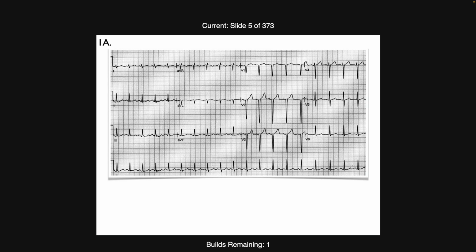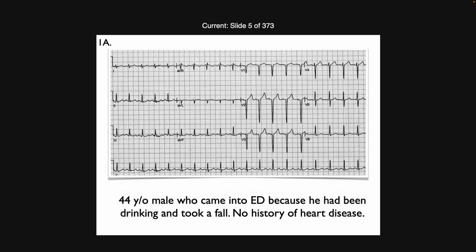Okay, let's see. Here's the first one, and I want you to look at the 12 lead, see if you see anything notable. So just spend a minute just kind of looking. Then after you look at the 12 lead, see if you see anything.